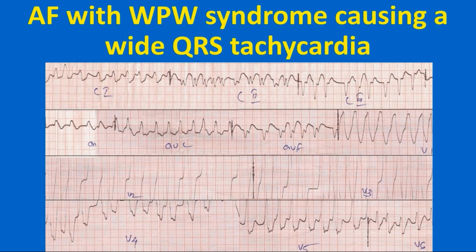Usually this is mistaken for ventricular tachycardia in the emergency department and cardioverted because of almost invariable association of hemodynamic compromise. Close inspection of the ECG, often retrospectively after cardioversion, shows the distinct variation in cycle length, over 50% difference between the shortest and longest RR intervals, indicating the underlying rhythm is atrial fibrillation.